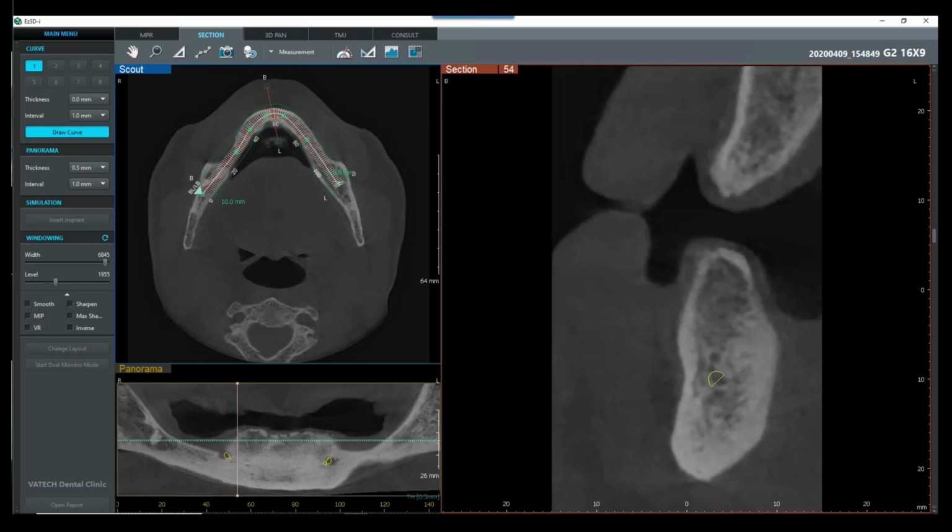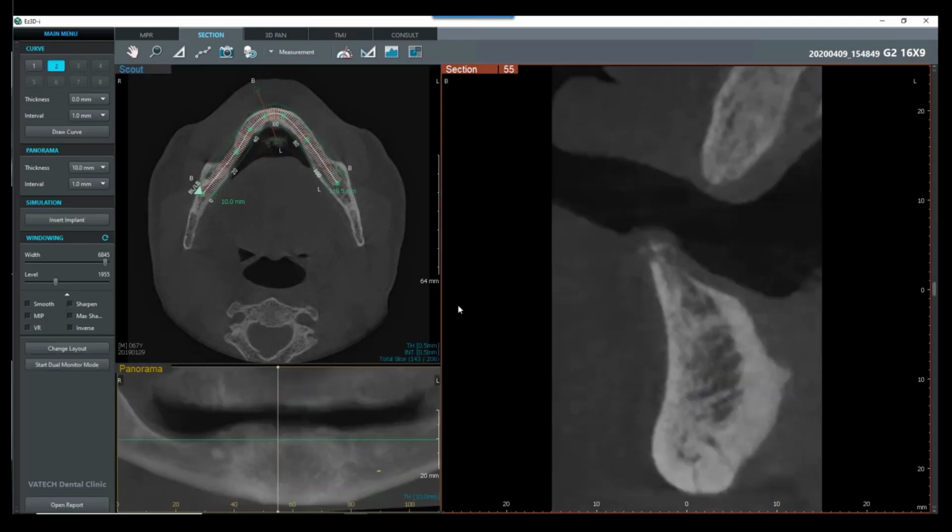And let's double click. And what I want to do now is find our nerve so we can see them here. We had our measurements there. Let's go ahead and take those again. Actually, let's do this. Let's go ahead and go over to insert implant, and we're going to go ahead and place our implants here.